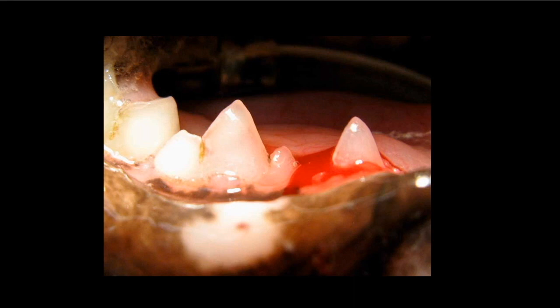Moving on, let's talk briefly about something else that's really, really common as a case example, and that is tooth resorption in cats. So we've got this image. Take a look at that. Look at those two teeth that you can see. There's obvious changes there around with the bleeding on that third premolar there, the one on the right side. The fourth premolar, you have to look really close to see the changes on that. But take a look at that, see what you think, and then I'm going to show you the radiograph.